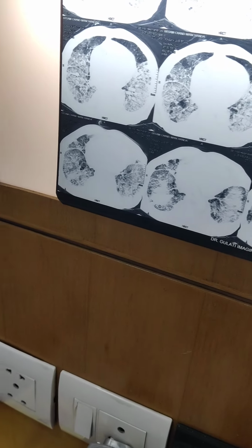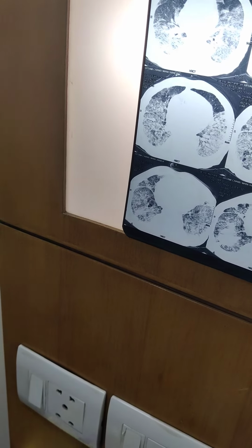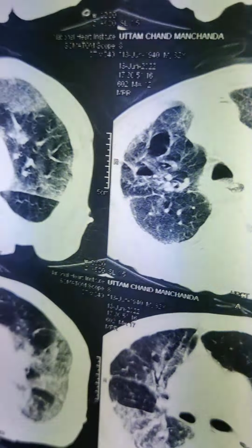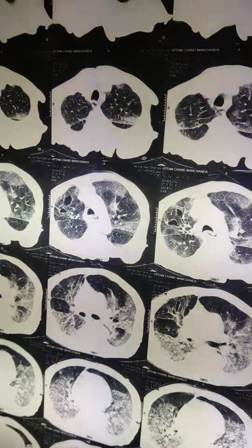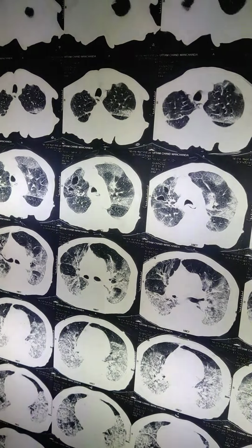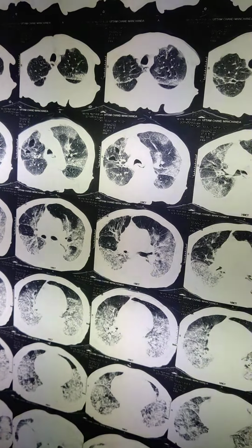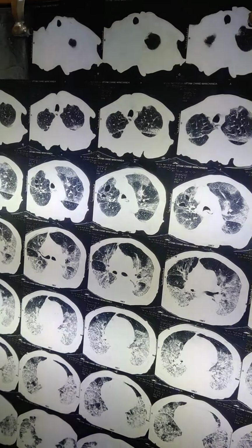Number two, if you see very carefully here, and if I show you here, there are certain emphysematous, cystic changes. These could be bullous changes. These are also pneumothorax, bullous changes are also. This is very unusual here, which has also been seen. Maybe he has a pre-existing emphysema, we don't know, but these are also changes we have seen. We have to compare with the previous CT. Now this is one thing.